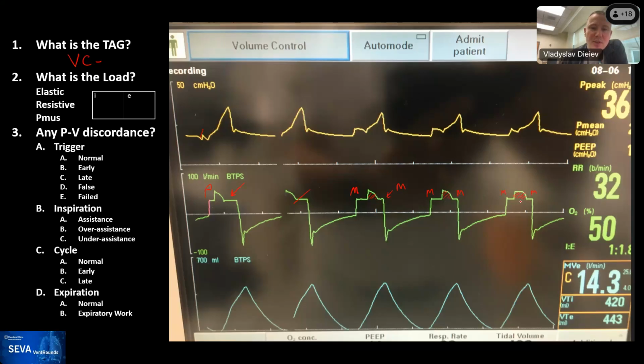And you can see on the pressure waveform, there is a concurrent distortion of the pressure waveform downward that corresponds to this acceleration in flow. And the inspiratory time on each breath is actually a little different, because to deliver the flow, the ventilator will now need to adjust the time, because it's volume control. So to keep flow the same, the inspiratory time needs to be adjusted to account for those little inspiratory efforts of the patient on top of the breath.